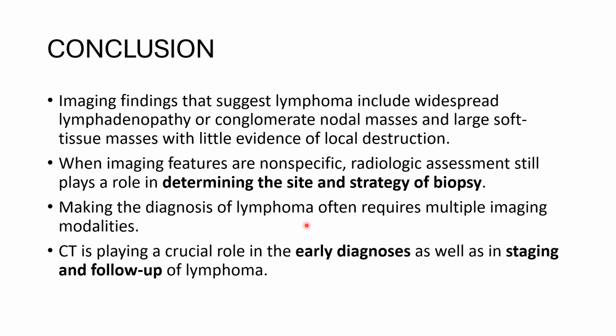Making the diagnosis of lymphoma often requires multiple imaging modalities. And why are we discussing CT? Because it is commonly available as compared to MRI, easy to access, and it plays a crucial role in early diagnosis and also in the staging and follow-up of lymphoma.